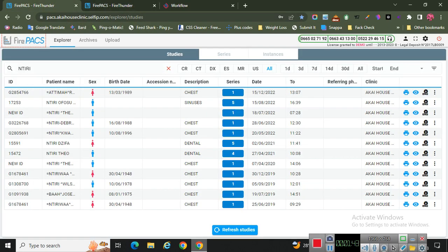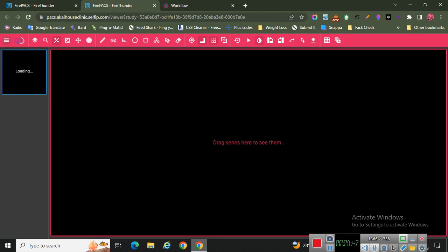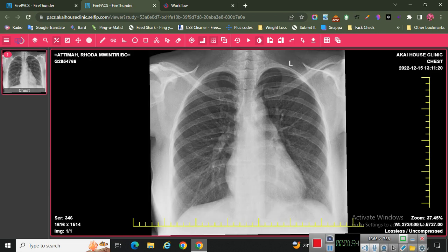You can view this image. You click on this icon and it opens a new window. You click these three bars here, and then it loads and you drag and drop. That's basically to view, drag and drop. As for the icons, if you put the cursor on, it tells you what they do and stuff. So you're not going to use this much because it's just basically storage.